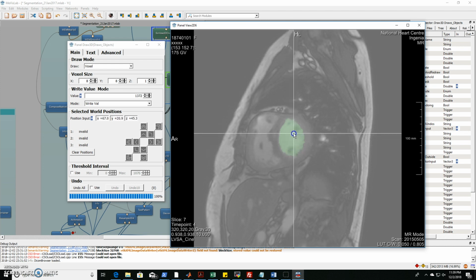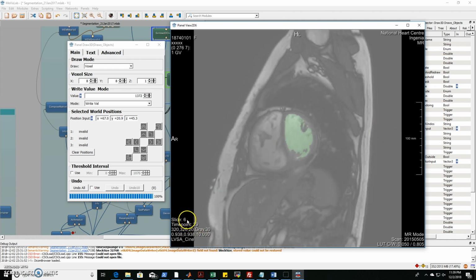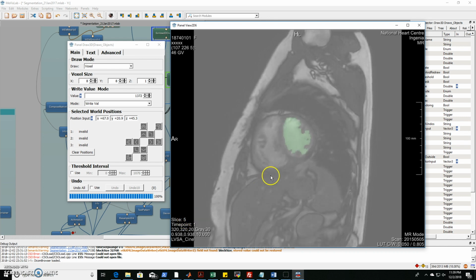When you're doing this, you'll go through every different time point and make sure all of them are good. Once you get done with all those time points, you'll move down a slice and do all those, and then move down and do all those. Sometimes the macro actually overestimates, so you'll have to take that into account and erase what it's doing.